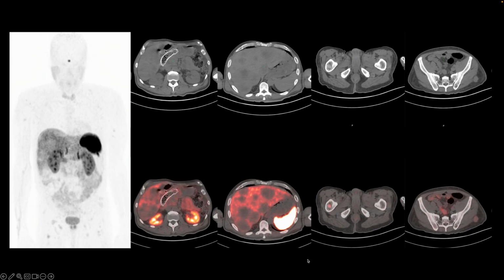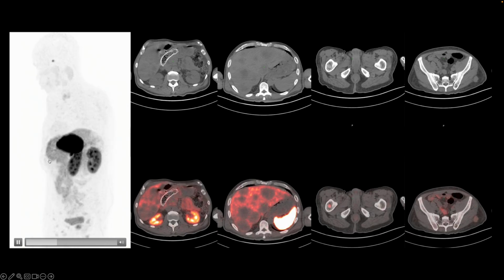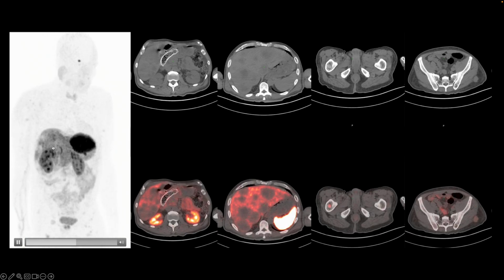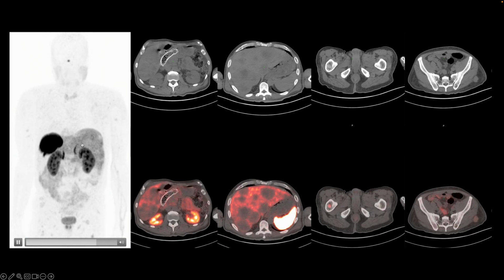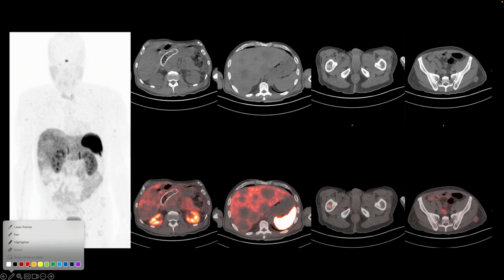Here's our next patient. They were diagnosed with neuroendocrine tumor arising from the duodenum, and we performed a DOTATATE PET-CT for whole body staging. And on this rotating image, we find that the liver is enlarged and has multiple photopenic defects inside the liver. And on cross-sectional images, we find that here is the mass in the duodenum that does not take up DOTATATE.